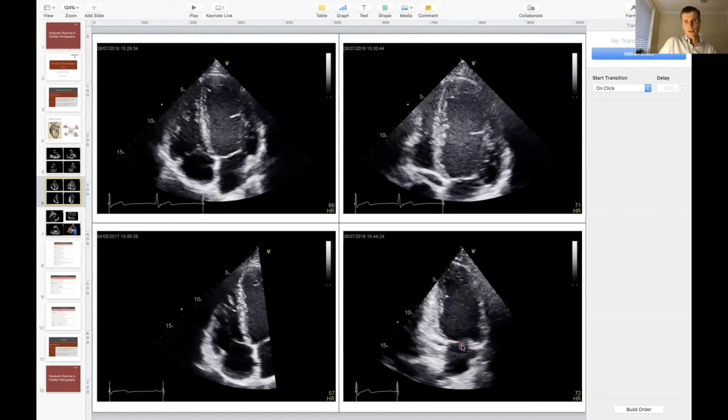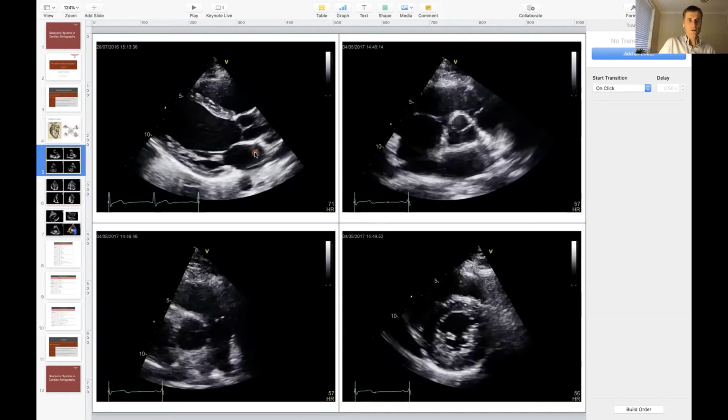And down on the bottom right hand part of the screen, what you can also see is another feature of the left atrium. You can see the left atrial appendage. So I hope to be highlighting the fact that what we can see from these standard views is a lot of anatomy. Let me just go up here as well. So in the very first image we've got, it's the left atrium here. You can see, as I said earlier, the interatrial septum, the left atrium there.